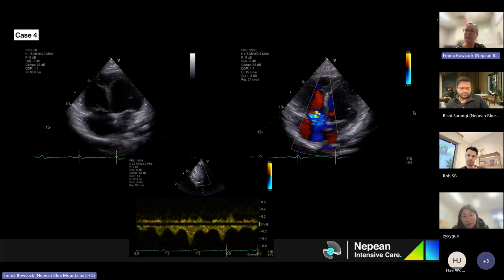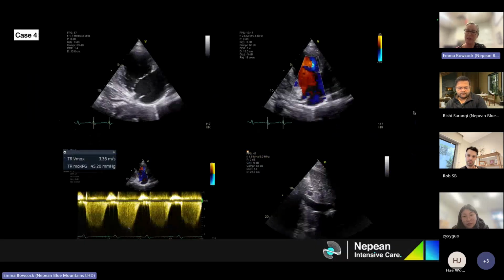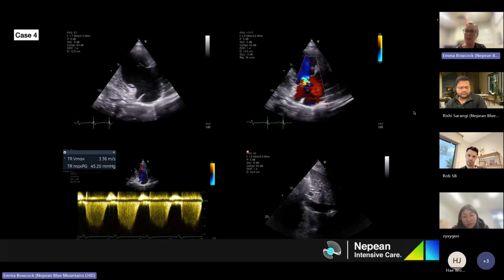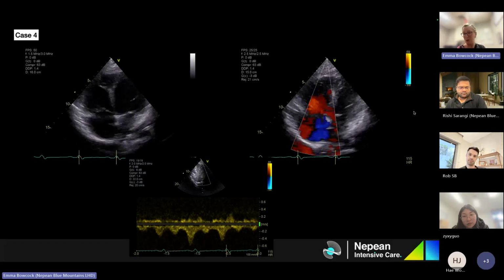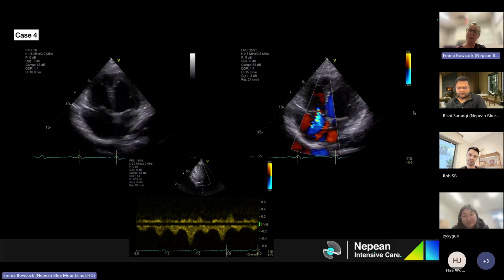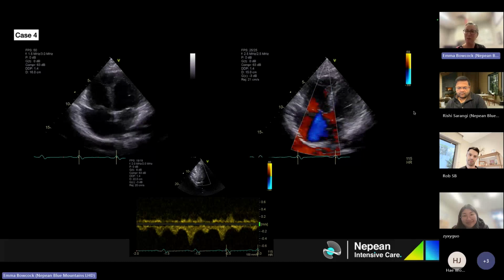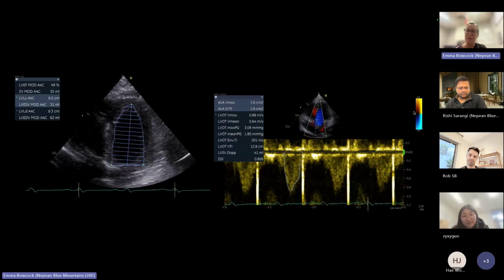So the lack of hepatic vein systolic flow reversal, and also there's not that sort of dense V cutoff sign as well. And then in this view, it looks moderate. So if I had to choose and someone was forcing me to say moderate or severe, I'd probably say moderate. But I might hedge my bets and say mod severe until you give me more information, like I've got all of the values to glue together. So a word of caution.